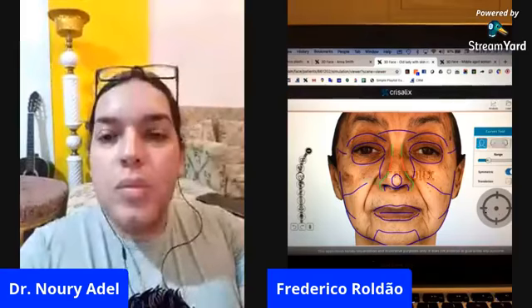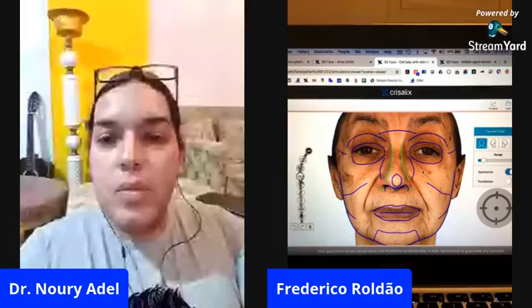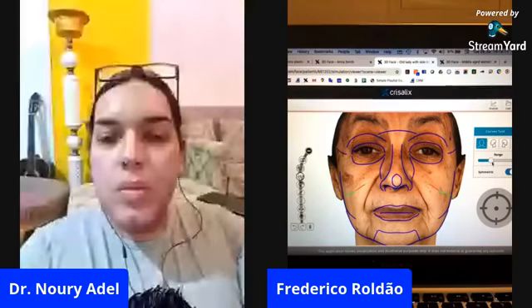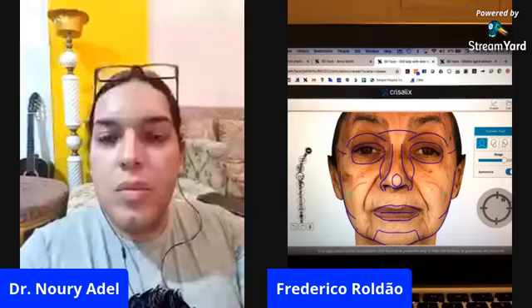Okay. And I will go to the alar here and I will narrow them a bit as well. I will then raise and try to give some volume here on the cheekbones by raising the skin like this. Okay.